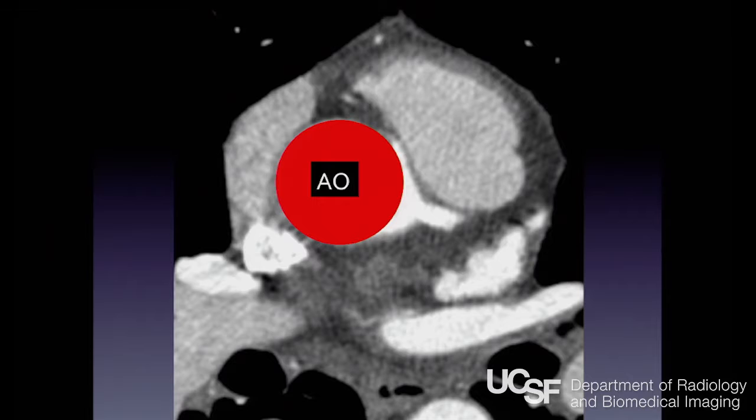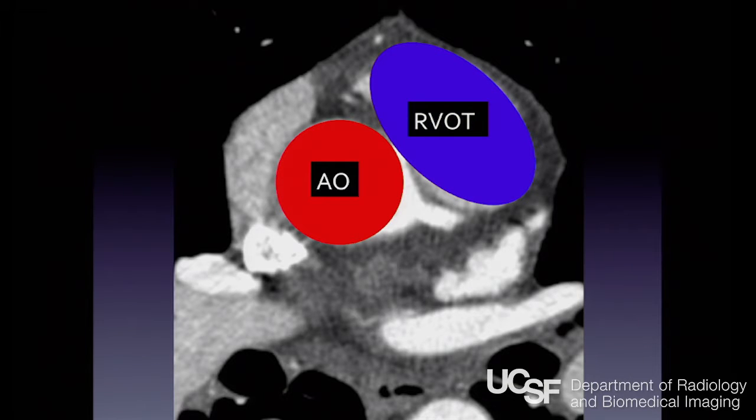So there's the aorta, there's the pulmonary artery, sorry, the right ventricular outflow tract. The right normally originates very anteriorly and extends right directly into the atrioventricular groove. The left originates more posterolaterally. Okay, so those are the normal origins. So this is an example of the right coming off next to the left, from the left sinus of Valsalva. And there's a few ways that can get back to where it needs to go.